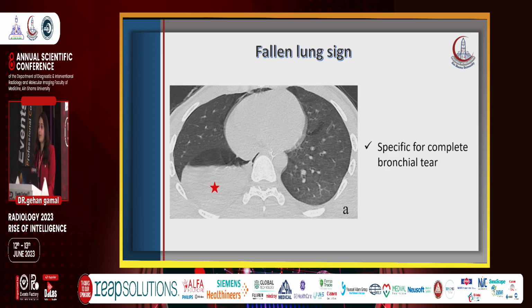CT can detect tracheal and bronchial wall defects. The fallen lung sign is a rare but a specific sign for complete bronchial tear, where the collapsed lung appears away from the hilum at the dependent area of the chest.